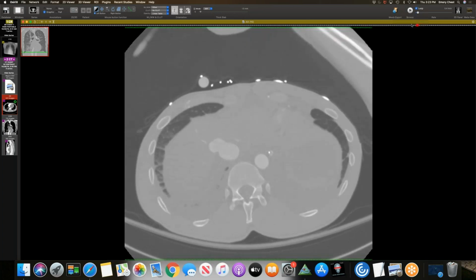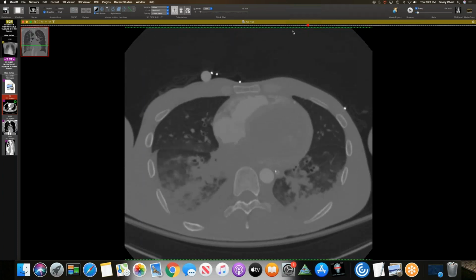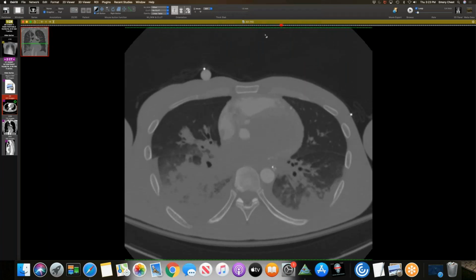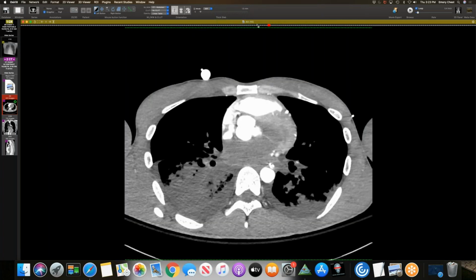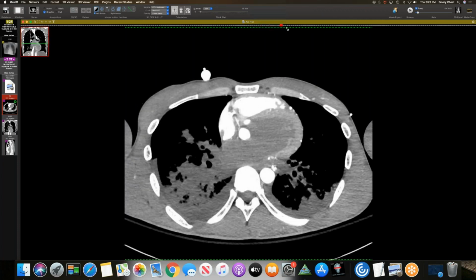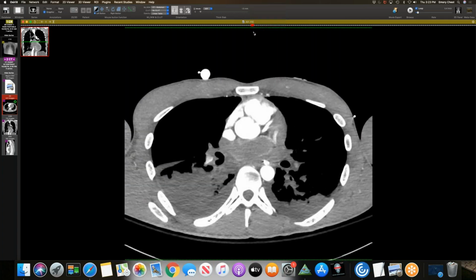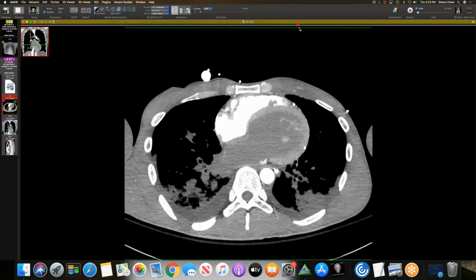So the arterial is coming through the femoral, and the reason you have all this opacification of the aorta is because there's retrograde flow, obviously, from the femoral artery. But because there's such high afterload, I guess the aortic valve is not opening. So you see the contrast goes retrograde, but it stops at the valve, and you get good perfusion to the great vessels and coronaries. But the heart continues to dilate, which is not really ideal. So they have to kind of decompress that. Nice.